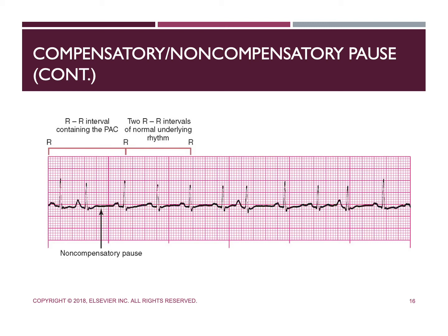And that is 2 RR intervals of normal rhythm, all right? So from R, remember Q is the bottom, R is our big waves to the very top. If we go from beat 1 to beats 3, 4, and 5, that is 2 normal RR intervals.